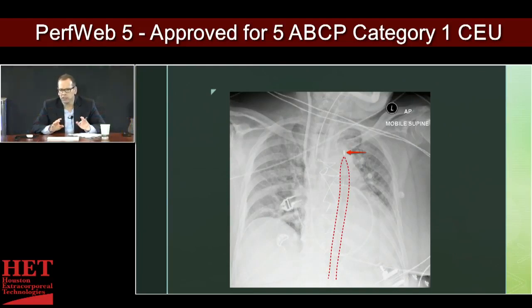The patient obviously looks like they have some vascular congestion. You can see the endotracheal tube is in. I would say that this endotracheal tube is a little high because from where I'm sitting, the carina I see is essentially right about here. It may not be quite so high then. And then you could tell that the balloon pump's in the appropriate position. You could see that the Swan-Ganz catheter is in the right main PA, or even actually in just the distal main pulmonary artery. And so this is a pretty typical post-op chest x-ray in a patient that's had a cardiotomy and has a balloon pump.